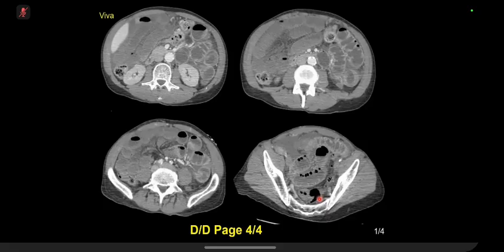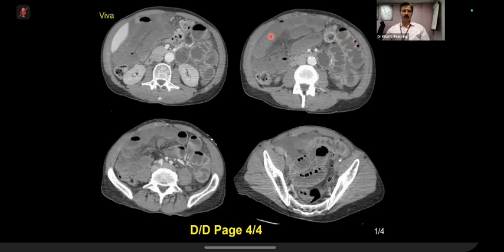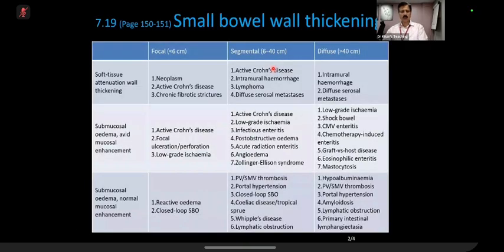Okay, the bowels also become featureless. There's a lot of fat stranding. Right. The main thing is that if you see here, I wanted you to pick up this discrepancy. Look at these loops, and it shows normal enhancement of mucosa. These loops are not enhancing. So other than pneumatosis, perforation, large vessels, always try to look at the bowel wall also. And you might get this kind of finding. In this case, when laparotomy was done, this was 8 feet of bowel which was necrosed.